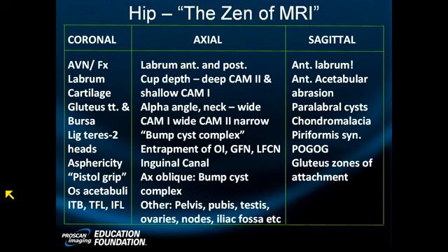Now what's that? That's a recess. Why is it a recess? Well, let's blow it up. It's pretty smooth. It's got a little curve to the top, and there isn't one scintilla of swelling. Not in the bone, not in the cartilage, nowhere. That's why it's a recess.